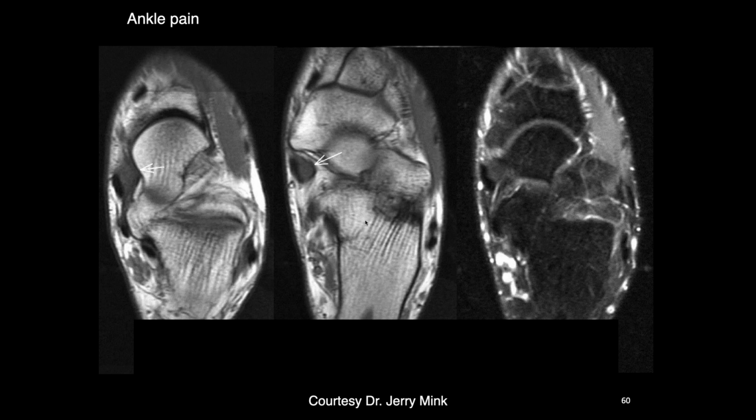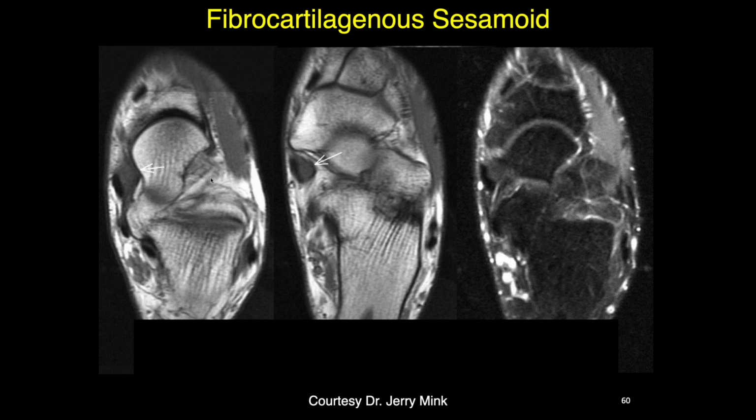So the distal part of the PTT, where it attaches close to the navicular, if you look at it histologically, it doesn't look just like tendon there. It typically has fibrocartilage, which develops in a substantial amount of the distal posterior tibialis tendon, and this is actually normal. People often call it tendinosis, but this is the normal fibrocartilaginous distal aspect of the posterior tibialis tendon, where it becomes thickened, and it often will then insert in a broad band here on the navicular. But this also is the area where you develop the accessory navicular ossicles that we'll talk about in a minute, in this fibrocartilaginous matrix that's normally in the distal part of the posterior tibialis tendon.